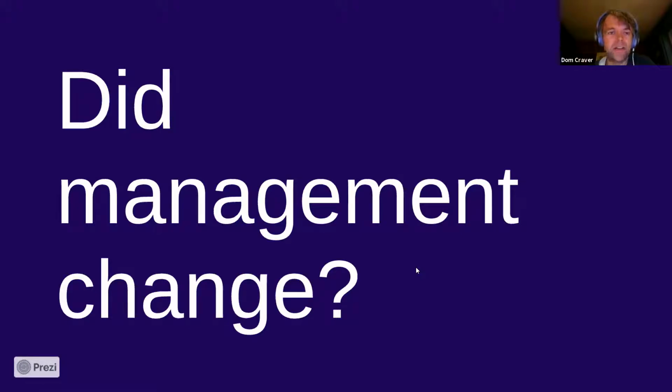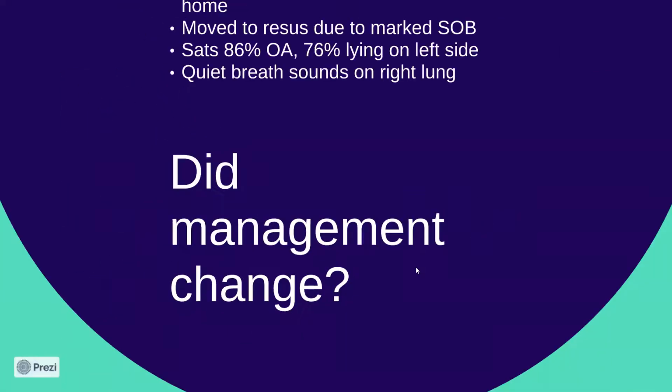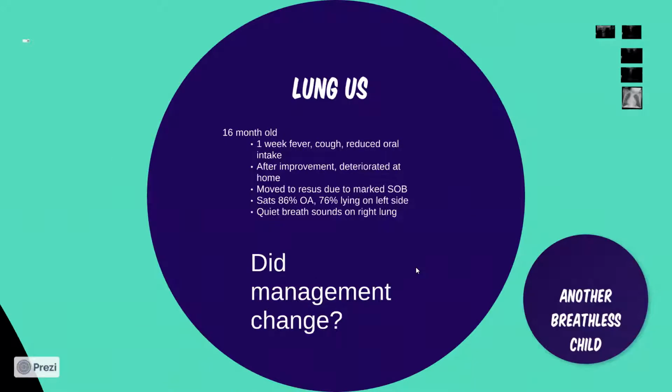So has anyone got any questions about that so far? Just holler if you do. Yes, a great case, Dom. Even though in that case the findings were clear on the chest x-ray, they may not always be. Exactly, lung ultrasound may be more sensitive and may pick up stuff that isn't visible on the chest x-ray. Exactly. There's a question from Yukiko.